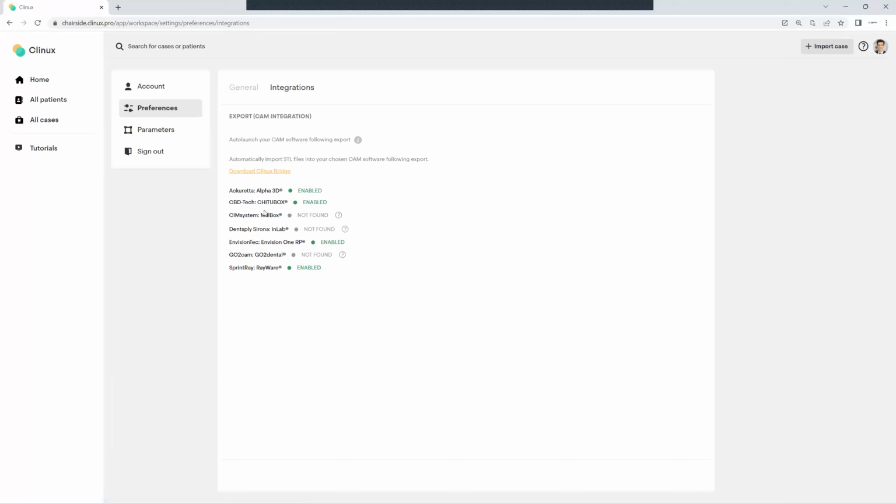Why do I have these ones and not the milling cams? That's pretty simple. All the 3D softwares are free, and you can download them at any time, as I did. But all the cam softwares you have to pay for, and I don't have a demo license on these ones or anything like that.